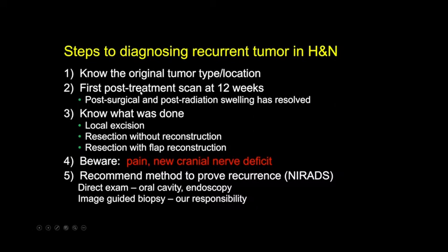Hopefully, the first post-treatment scan is at 12 weeks. In that way, the post-surgical and post-radiation swelling will have resolved. The scan that you're looking at, know what was done. Know if they did just a local excision of the tumor, if they resected without reconstruction, or if they resected the mass and did a flap reconstruction.